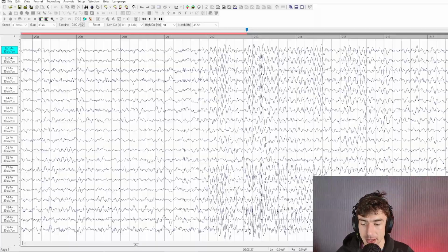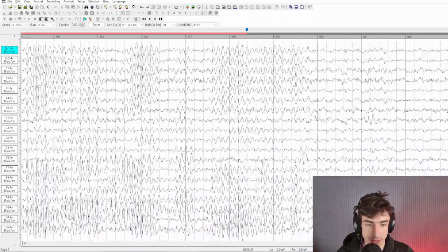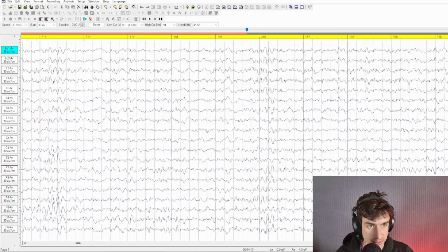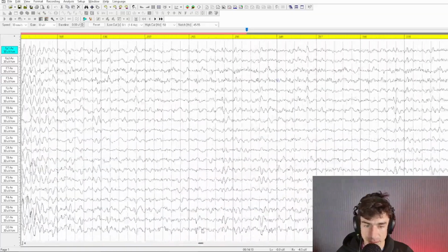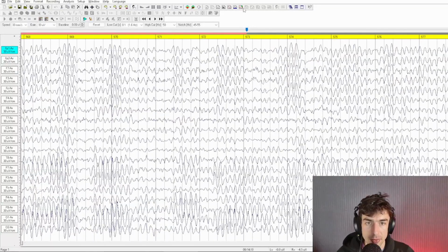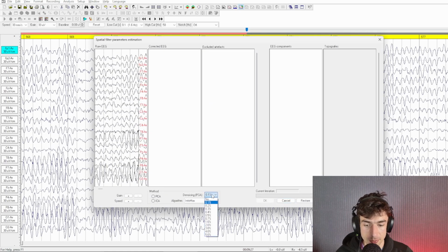And this is one we may not even need a whole lot of cleaning up on. So I'm going to zoom past this so that we don't go through the entire thing twice, since this one's a longer recording. And we're going to see if we can pull out any of the eyelid flutter and lateral eye movements and EMG. And then we'll go back through again and extract our salient fragments.